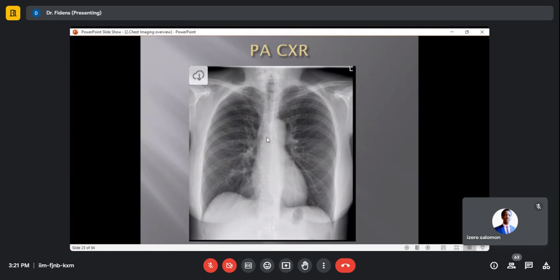Yes. Can you see the pleura? You can't see the pleura unless it is thickened, otherwise you see this line of the pleura. There is no pleural effusion because it is sharp, no pleural effusion, it is sharp. The heart you can see.